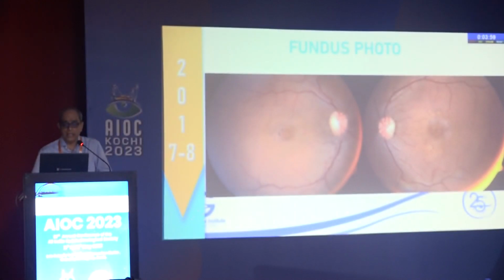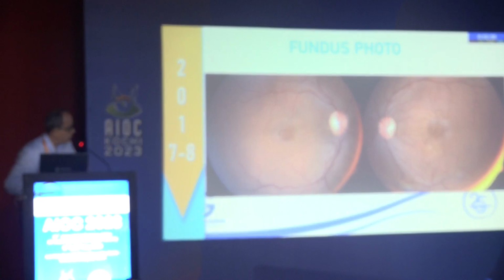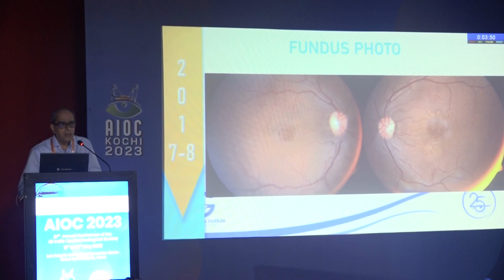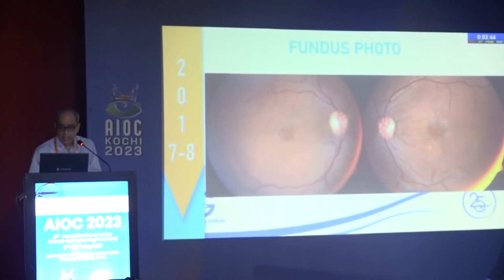Okay, macular telangiectasia. Now this is the last thing. Okay, now what do you see in this picture? Pigmentation in the right eye. So parafoveal pigmentation, very diagnostic of MacTel. And then what do you see in the left picture? You see one dilated vessel. You see the right angle vessel there?